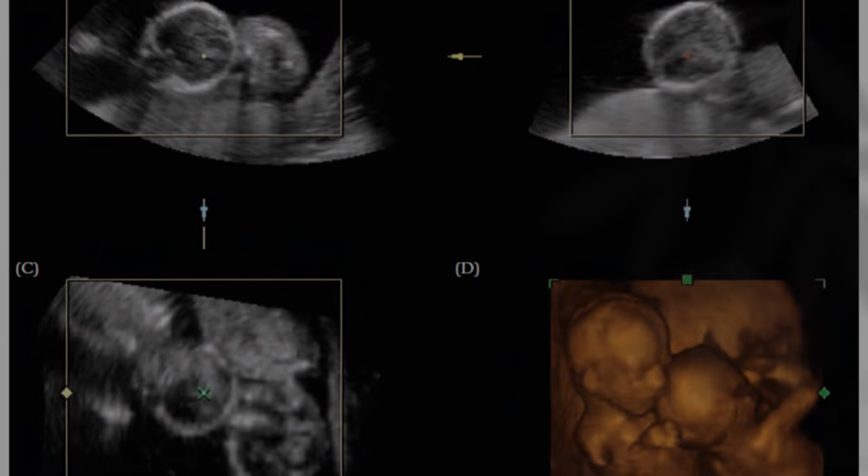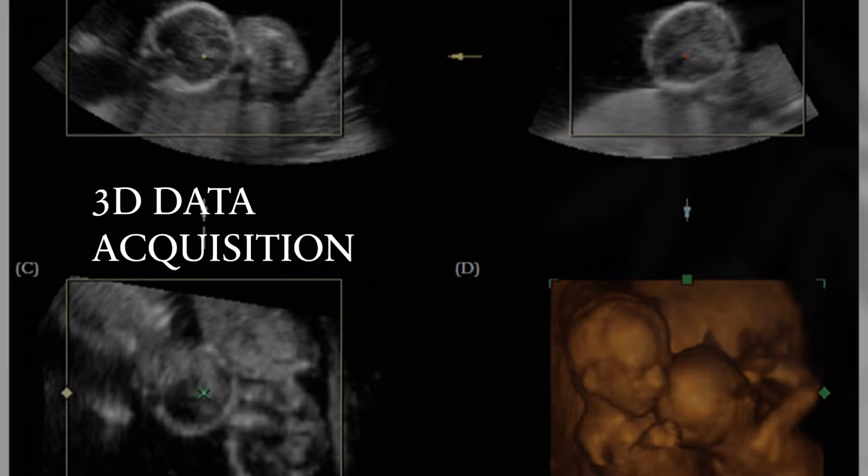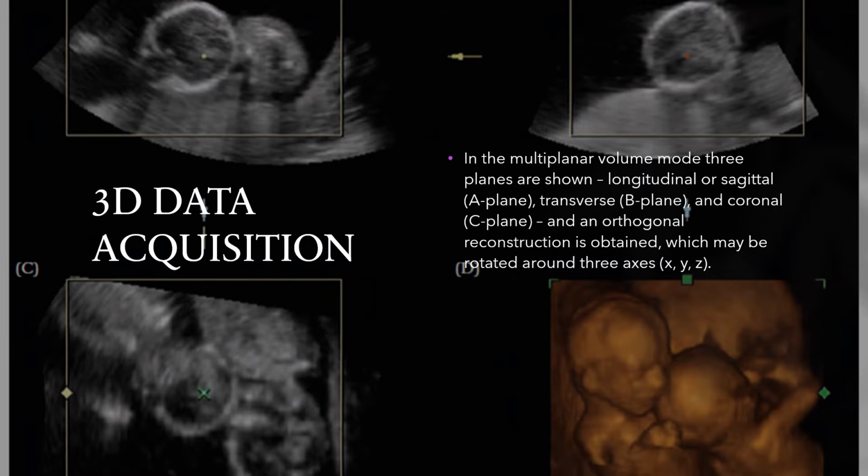In the multiplanar volume mode, 3 planes are shown: longitudinal or sagittal in the A plane, transverse in the B plane, and coronal in the C plane. And an orthogonal reconstruction is obtained, which may be rotated around 3 axes, X, Y, and Z, for better evaluation of the included and targeted anatomy.